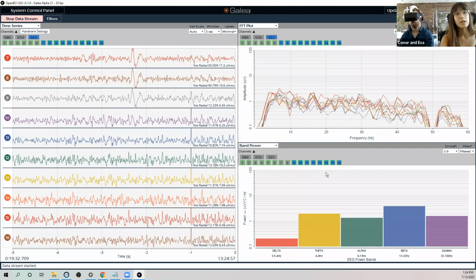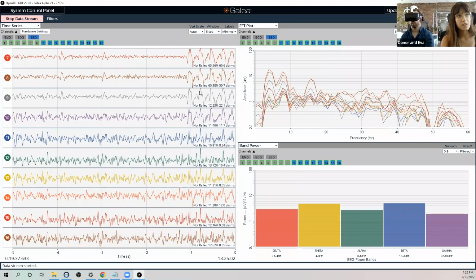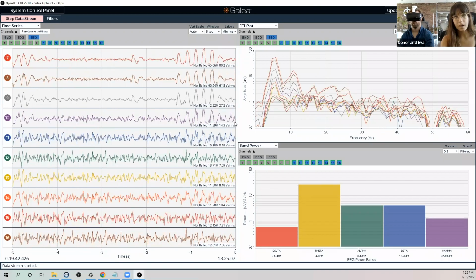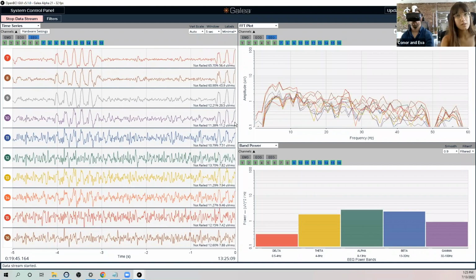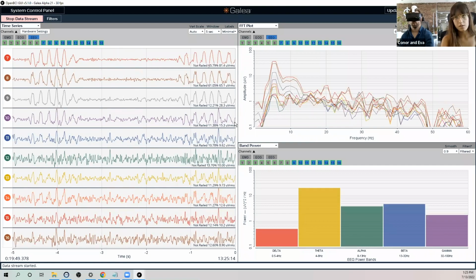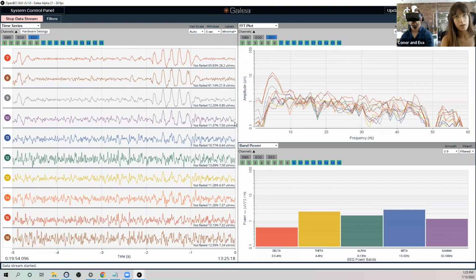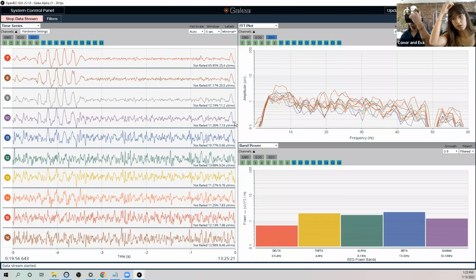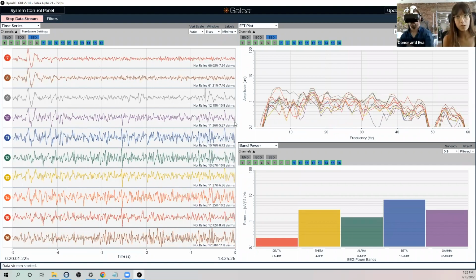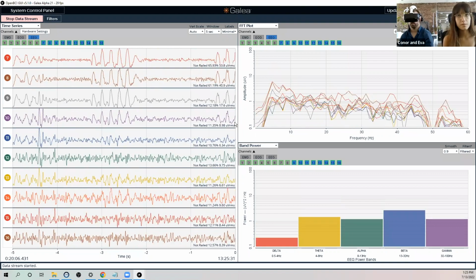So, okay, let's first show some blinks. Channels 7 and 8 are passive EEG. Like I mentioned earlier, they're on the forehead. And right now, Conor is doing blinks in sets of 5, I think. So you can clearly see them. These are the channels that we usually use to visualize blinks, but you can also see them propagate to 9, 10, because those are just at the beginning of the midline. So they're pretty close to where he's doing the muscle movement. Yeah, they look pretty good.